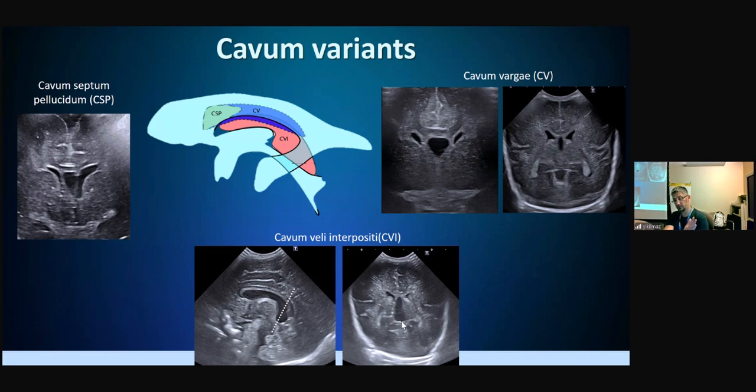This coronal triangle shape appearance is typical. They don't have any clinical significance. Once in a while, we see them dilated, forming cysts in the older children. Very rarely, they need to be intervened by surgery, but otherwise, this is just a normal structure. This is not a cyst. You don't have to do an MRI. You don't need to do a follow-up for this.